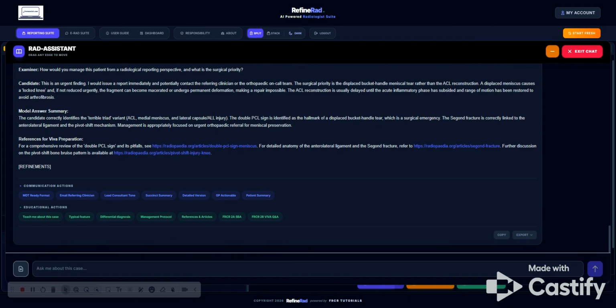So reporting doesn't stop with reporting. You can learn about the case, you can interact with clinicians, you can generate SBAs, you can learn the Viva pattern for any of these cases.